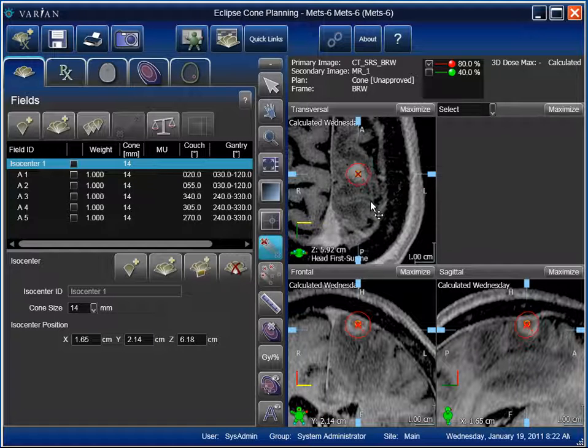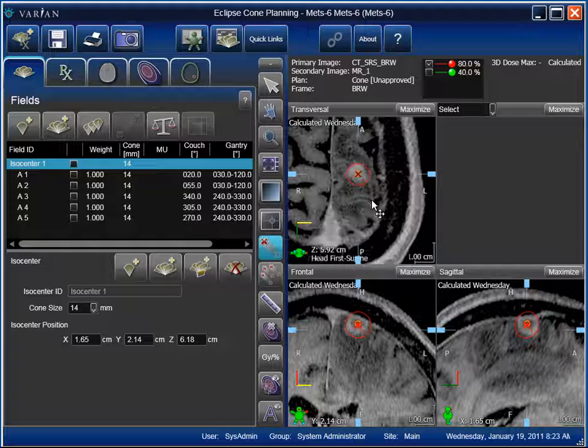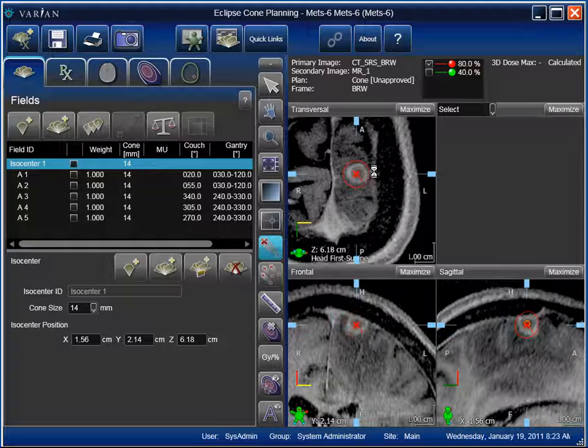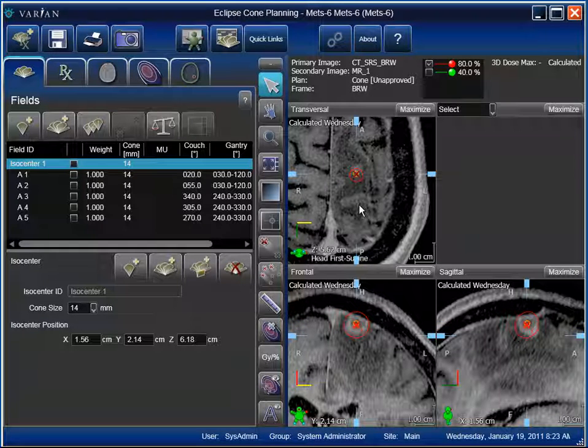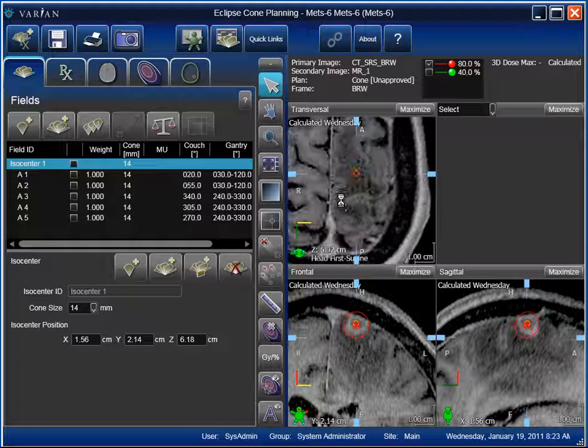See if we like that a little better. It fits a little bit better. We may want to actually go through and even tweak it a little more. We could play with this as much as we want. So let's just move it up just a touch more. We're going to go to one of these other views and just position it a little differently. Okay. And again, we'll turn that off, tool off, and now we walk up and down, and that looks better. And we'll now go to the second target.